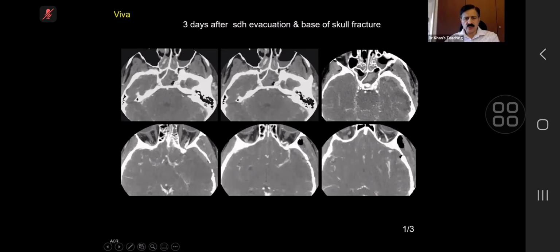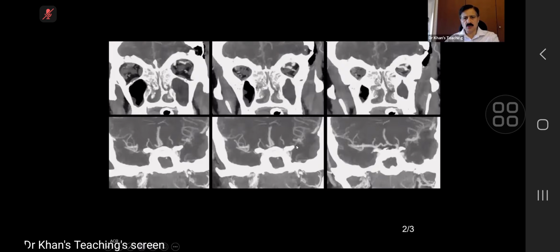In the cavernous portion, you should not see this vein, and it is definitely much more prominent. With this kind of history, a carotocavernous fistula comes to the mind. On a coronal, it is confirmed. Look at the superior ophthalmic vein, it has got ramifications, tortuosities, it is very prominent, has to be a fistula there.